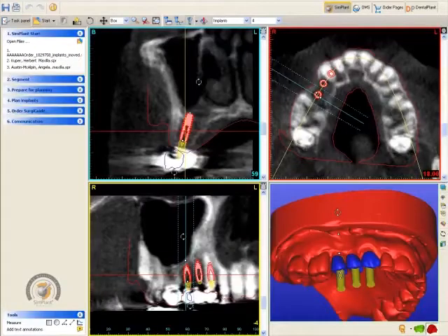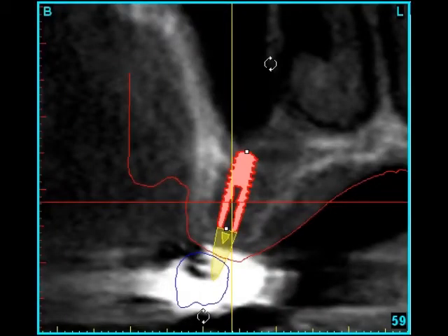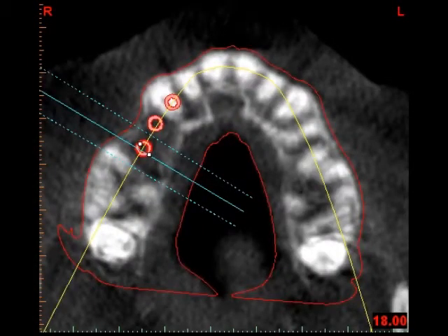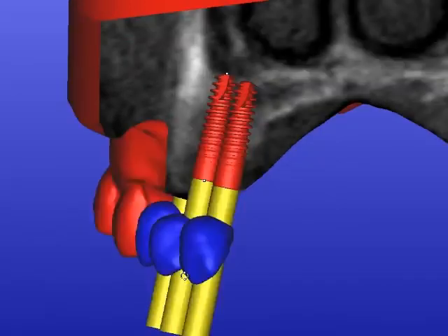Part of the treatment plan will involve not only classical cone beam imaging, this is for Materialise and planning of the case, but also utilizing optical scanning of the patient's dental model. This allows us now to accurately plan not only the placement and selection of the implants and sizes, but also the actual restoration itself.